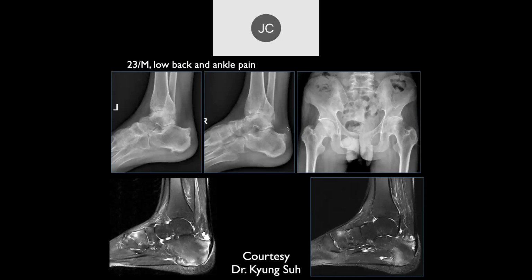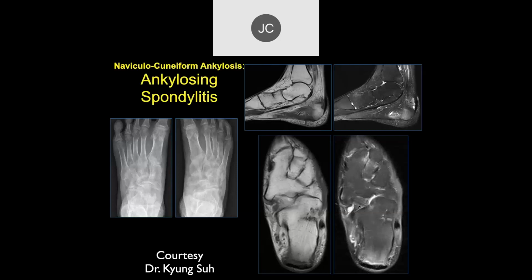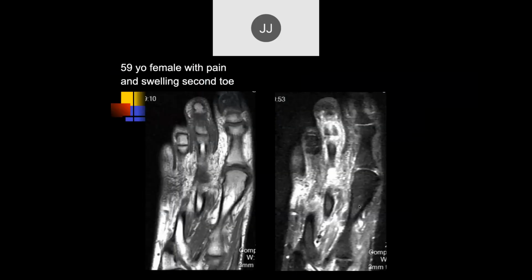And if we look here, this patient had back pain, and I keep coming back to back pain, and then we can see that they're also, yeah, a disease that causes fusions of the bones. Yeah, well, the SI joints fuse on that. And this is, yeah, ankylosing spondylitis. I was going to ask for the SI joints. Yeah, I think they were fused on those images. Go back here.